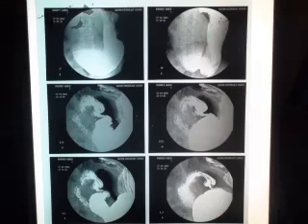Here the same, we can find a hugely dilated stomach due to cicatrized duodenal ulcer or gastric outlet obstruction. The same also here, no dye is passing from the stomach to the duodenum, a hugely dilated stomach reaching down to the pelvis. This is the iliac crest. You can see here down to the pelvis.